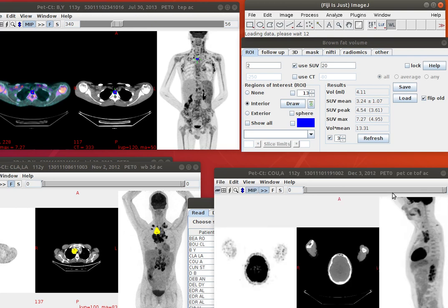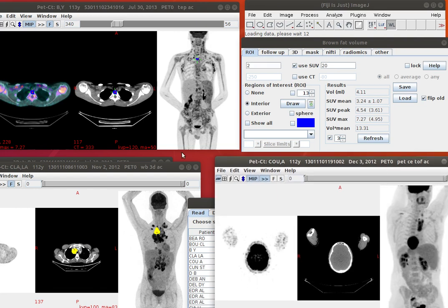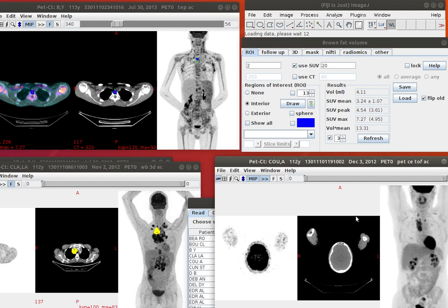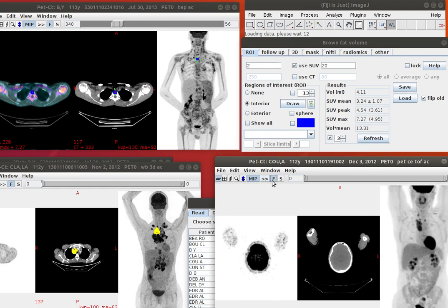Okay, it's come up, it's spinning around, but the blue dots remain here, and the yellow dots remain here. The meaning is this is the last study I looked at. Now if I click on this, let me put up this, stop the thing. The rotation. If I click on this and then click here, you will see this value changes to 0. Okay? And both of these are yellow. So this would be the blue dots if there were a previous analysis. Since there's no previous analysis, it's all 0.